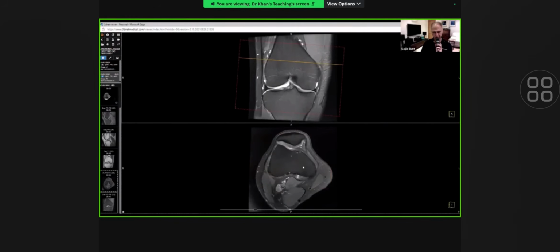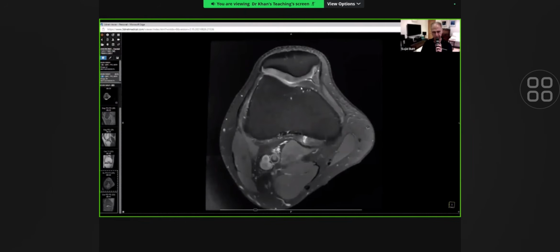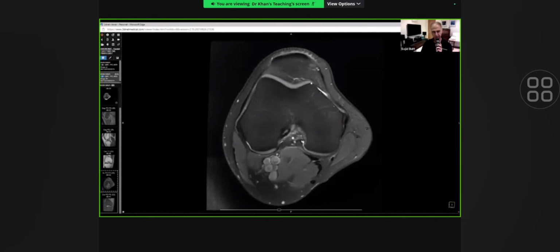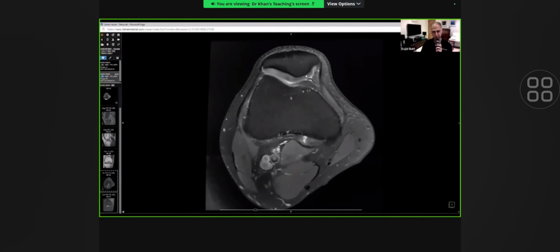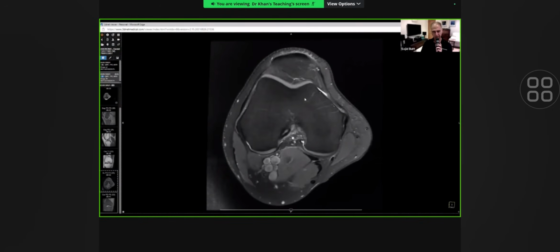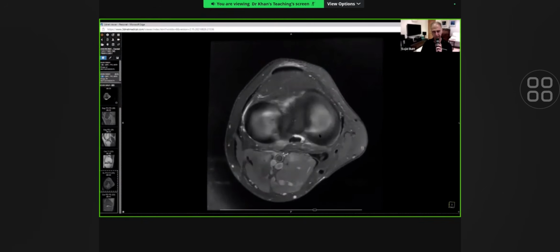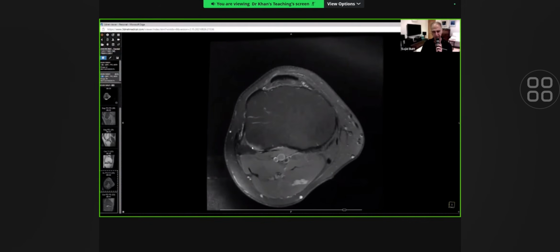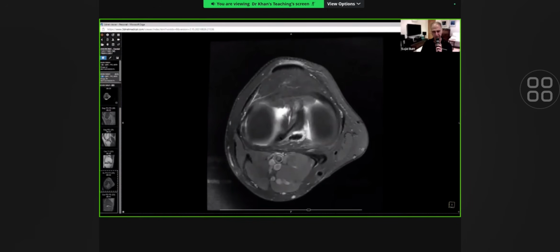If you look at the axial imaging, we can see that the trochlea here is quite well formed. So there's no dysplasia as we saw in the previous patient. No chondromalacia is seen. The cartilage is quite thick and of uniform signal intensity. As we come down, can you notice this oblique shaped meniscal tissue, which goes like that? So that's the lateral side. That's the posterior horn of lateral meniscus. And there is a ligament connecting that with the anterior horn of medial meniscus.